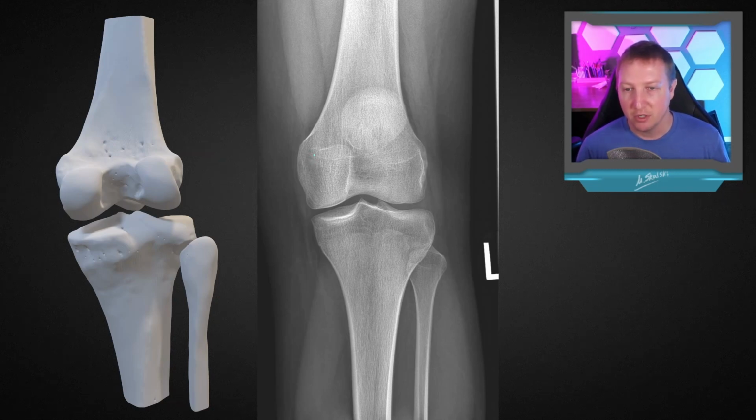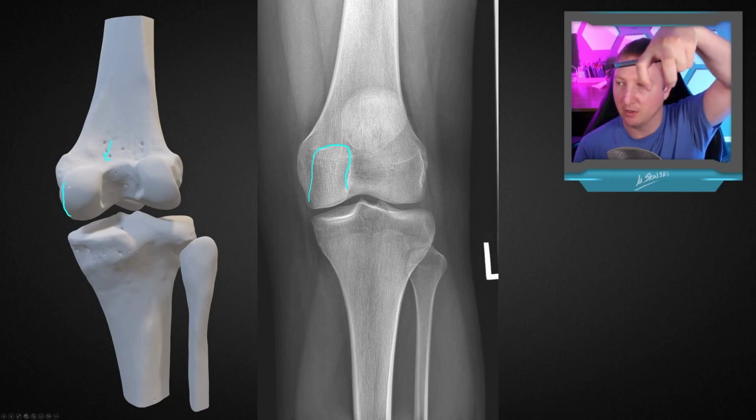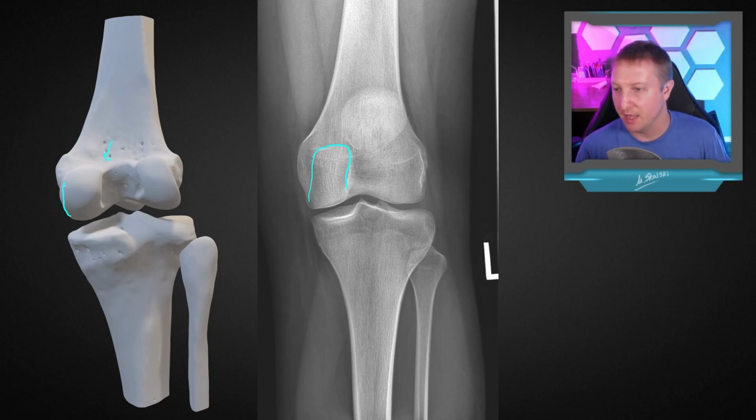Well, one thing you might notice is that you actually see the condyles really well through the femur. And so you can think of this as you're looking through it, or as you can see here, like they're coming out right at you. And they kind of curl around like this. And so that prominence gives you this cortical edge that you can see. And sometimes you'll see one better than the other. But that's what these lines are that I'm outlining.